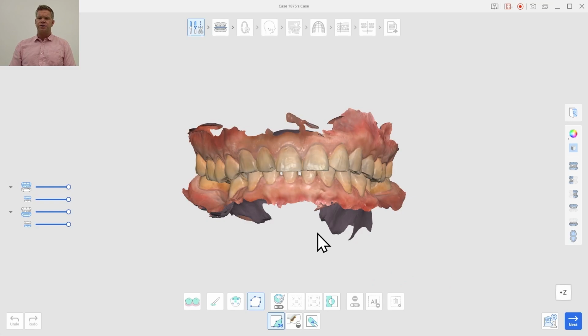Welcome to Meta Orthodontic Suite. Today we're going to discuss how to deal with missing teeth with this simulation.